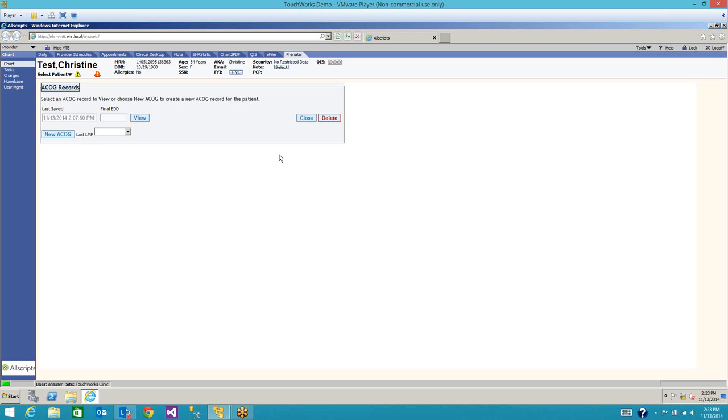For us, we're actually dynamically generating the ACOG on the fly. So we know exactly how much data is going to go into this ACOG at the point that we generate it. If there's 3 encounters at this point in the pregnancy, we generate 3 encounter rows. If there's 22, we generate 22 encounter rows. If you don't type any comments, we don't leave an empty page for comments. If you type 6 pages of comments, you get 6 pages of comments. So we can size the ACOG so that you don't have a bunch of empty area that's just dedicated to placeholding for where data might go.